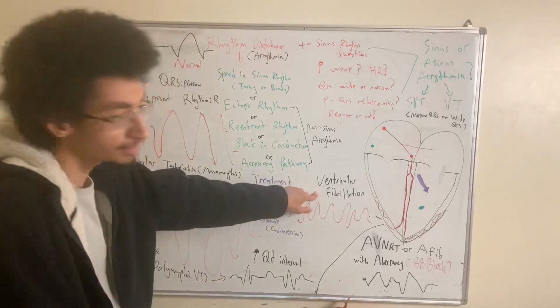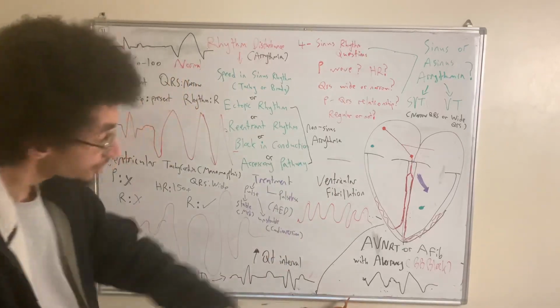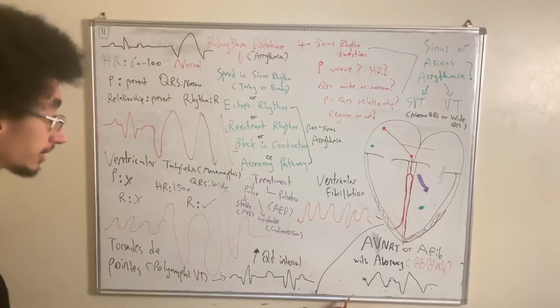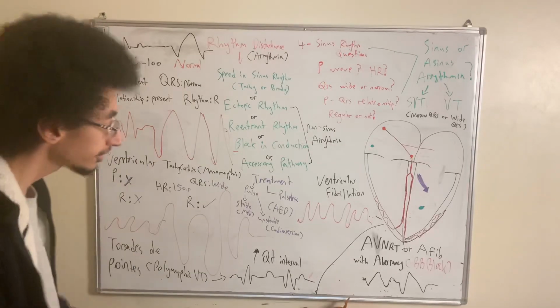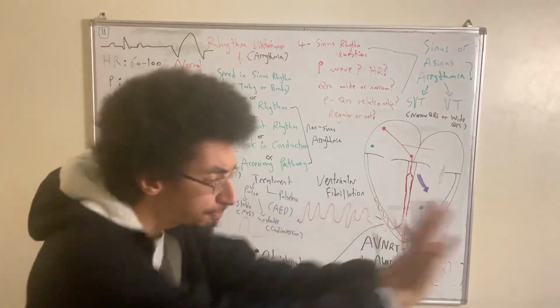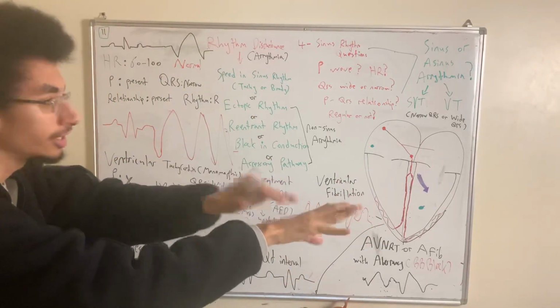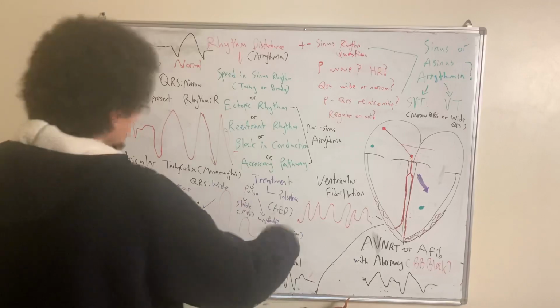Now this one is better than in people with true cardiac arrest, people with asystole, because there's electricity here, but it's still very bad. Yes, there's electricity compared to asystole, but it's very bad because this electricity actually is not causing depolarization for the ventricle. It's causing like fasciculation. It's causing like shivering for the ventricles. It's just touching it, but it's not pushing it. So you're basically causing shivering, or you're just touching the ventricle. You're depolarizing it, but there's not enough contraction from this electricity. So this is still very, very bad.